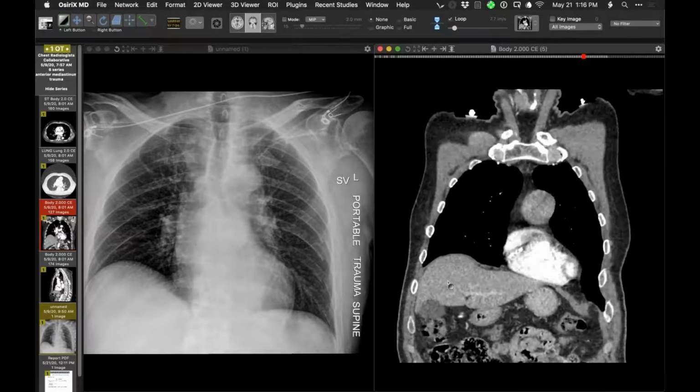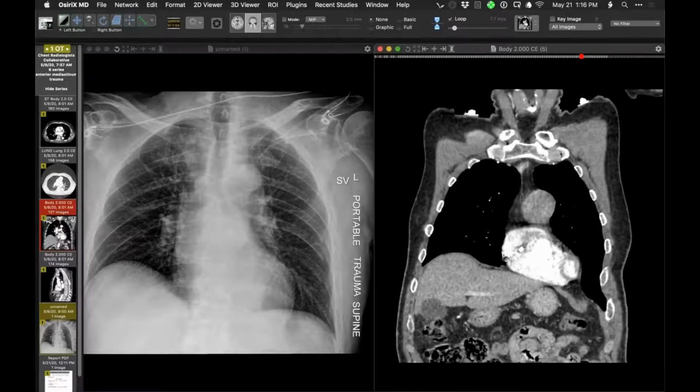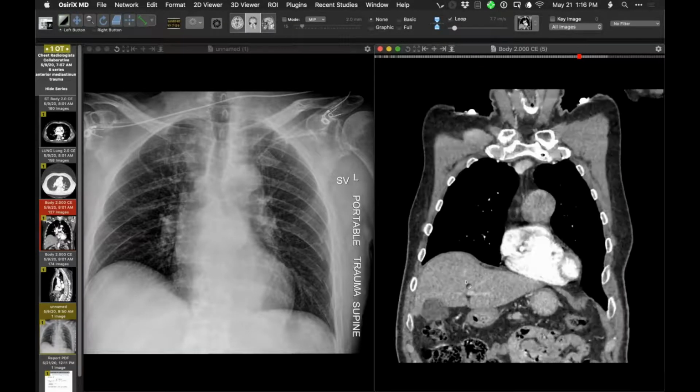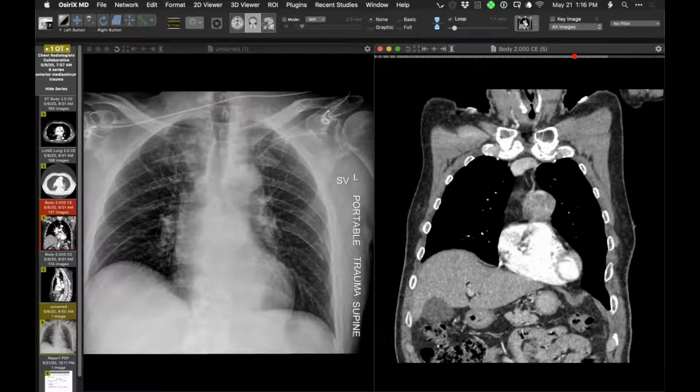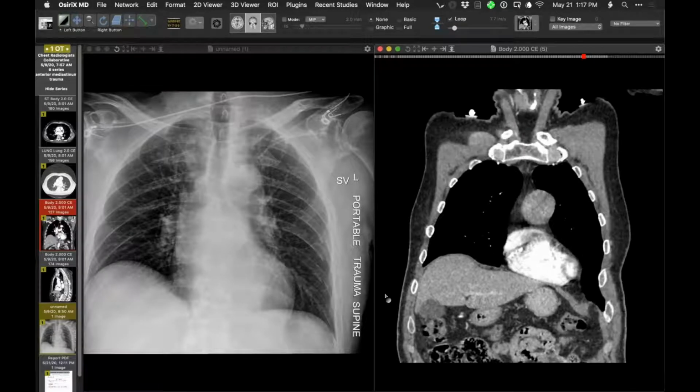It's anterior. There's the interface that we're seeing right here. There is the rest of it. And this, in my view, is very typical for a thymoma. So the incidental discovery of very likely a thymoma in the context of trauma. Because of the person's age, the patient has declined further evaluation. He is 80 years of age, and the likelihood that this will hurt him in his lifetime is pretty low, but very consistent with a thymoma.